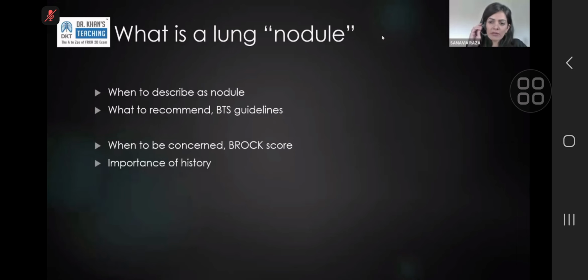So it can be a solid lung nodule or it can be a subsolid lung nodule. When we come to lung cancers, we'll talk about the morphology in a bit more detail. But for the lung nodule purpose, when we talk about nodules alone, I want you to focus on two different morphologies. One is solid and one is not solid, or for the purpose of a guideline, subsolid.